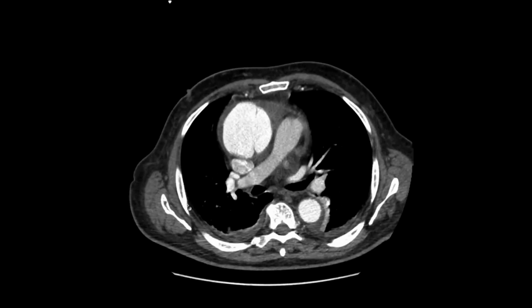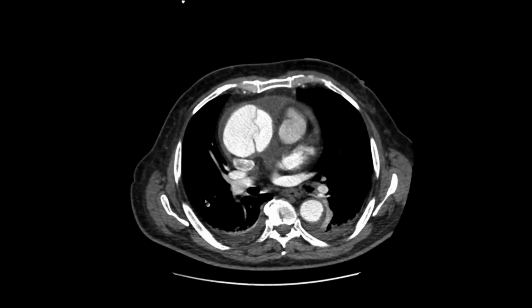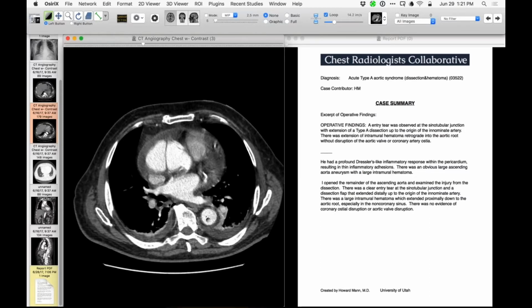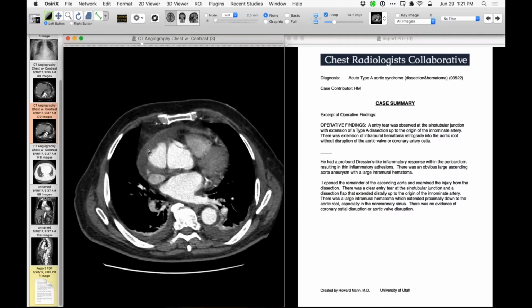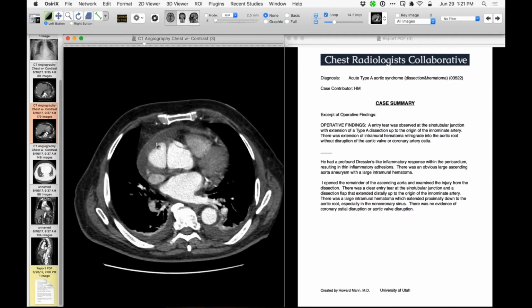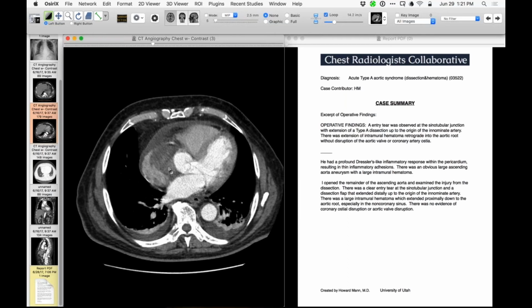Yeah. The right lateral aspect, it looks kind of thick and, you know, like it's an IMH that's complicated by dissection, maybe. Yeah, I think there's pathology in the wall there. And then there's contiguous pericardium here. And maybe more pathology in the wall coming down here, I presume? Well. Yeah.